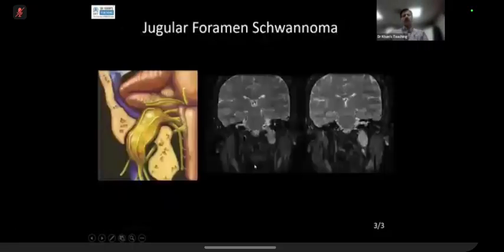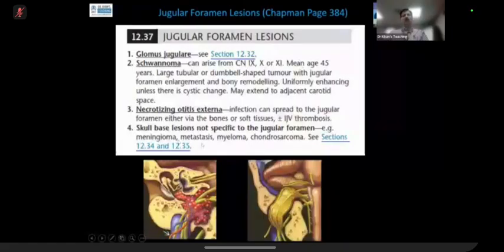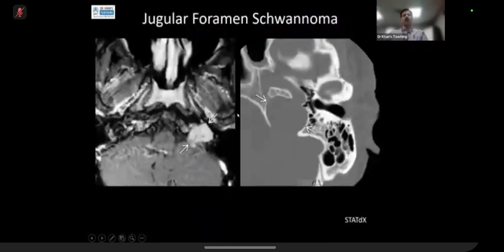Okay, excellent. Please remember, I've not given you all sequences, but you have tackled it very well, and it was a schwannoma. The key thing is, look at this picture, and you will remember it. Jugular foramen schwannoma. Just like a schwannoma anywhere, it will cause expansion of the bone. It will not cause permeative destruction. So remodeling of bone. Remember that in ribs and spine, etc., you will see the remodeling because of schwannoma.